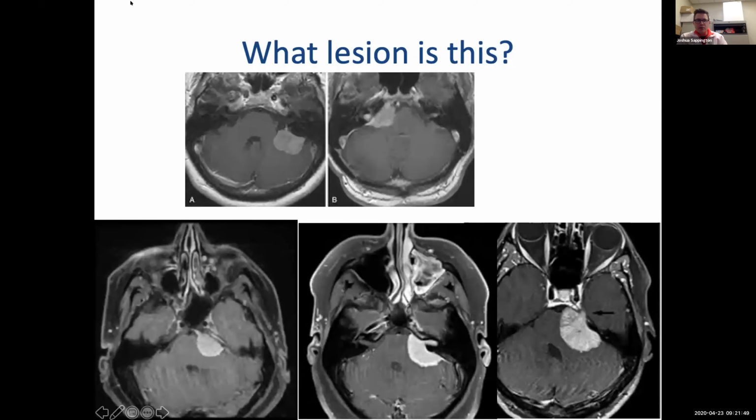So, meningiomas. One of the things from these different lesions that I tried to pull is that they look somewhat similar, particularly this one right here, maybe as an acoustic, but they look different. Meningiomas are the second most common CP angle pathology. They act and behave very similar to a lot of different kinds of lesions, such as the acoustic neuromas. But the unique thing about them is that these patients will oftentimes keep their hearing quite beautifully.